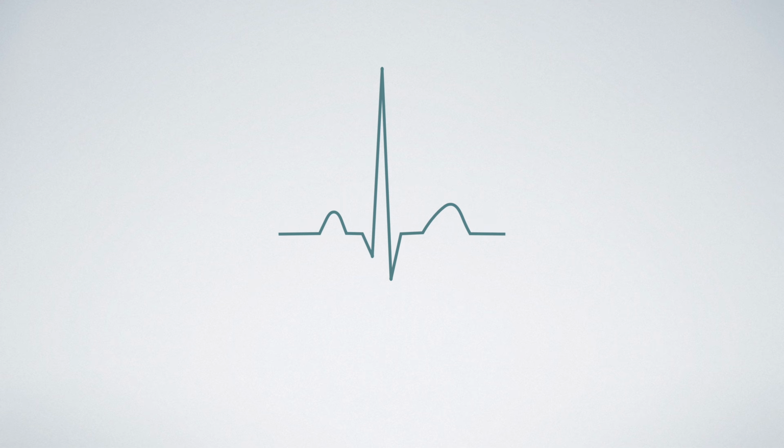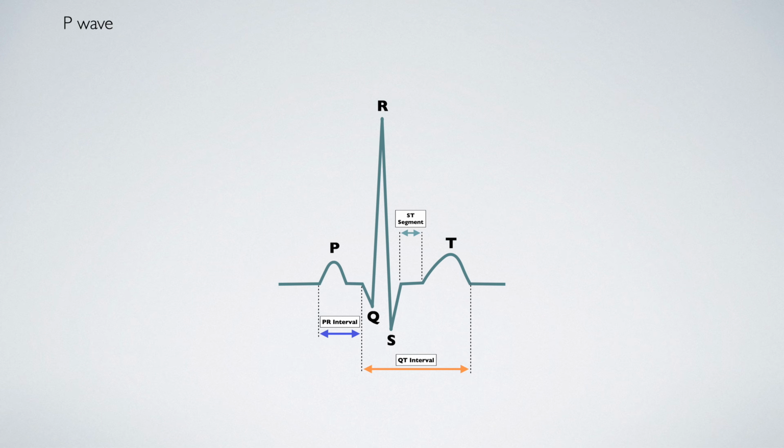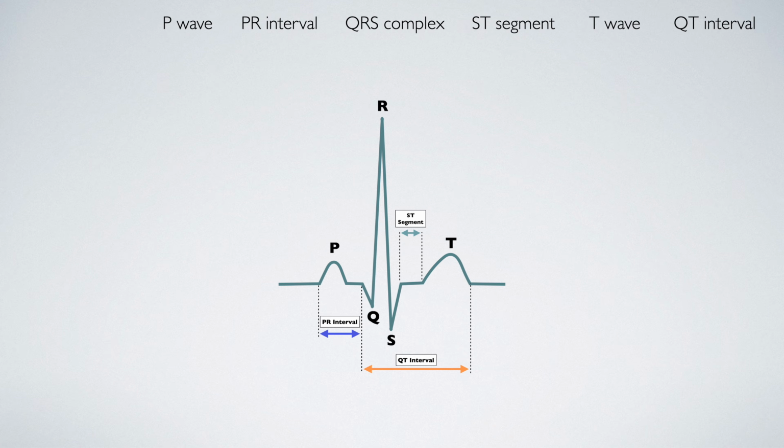In the previous episodes, we learned about the components of the normal ECG wave: P waves, QRS complexes, and T waves. We also learned about the segments and intervals. These components can be used to create a structure for working through ECG interpretation. In this episode, we will explore how rate and rhythm can be added to the structure to help analyze arrhythmias.